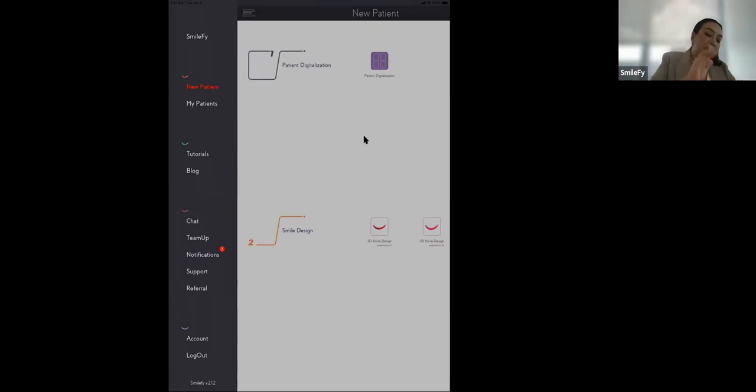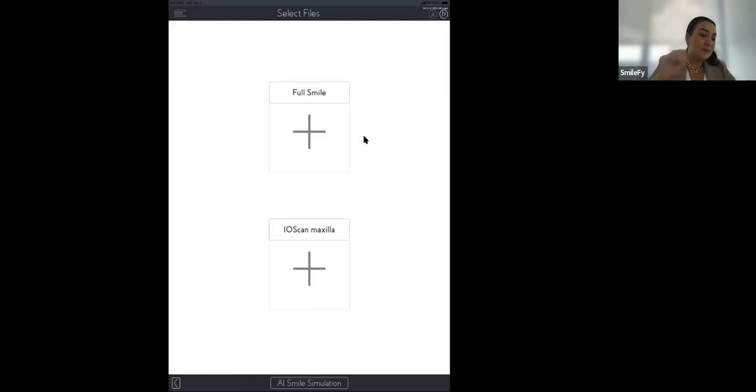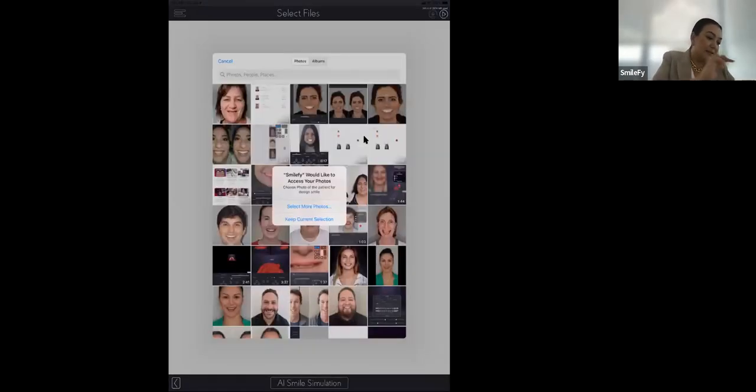Okay, so let's do another patient. I'm going to click on 2D design. The patient comes. I have the patient here. I'm going to get the patient from my library. And this is going to be my patient.